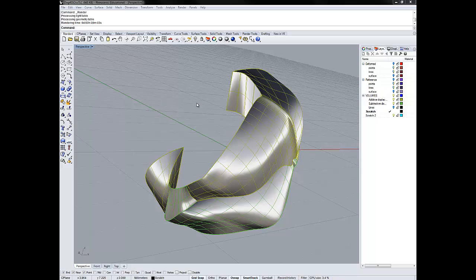Specific to this tutorial, we're going to be using a data set taken from canines. The points that are the starting material are metal markers inserted onto the diaphragm of the canine. When the dogs are subjected to specific breathing maneuvers, X-ray images are taken at discrete time points. Each of these maneuvers has two sets of points. There's the reference and the experimental or the deformed state.